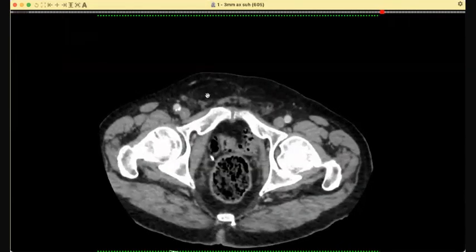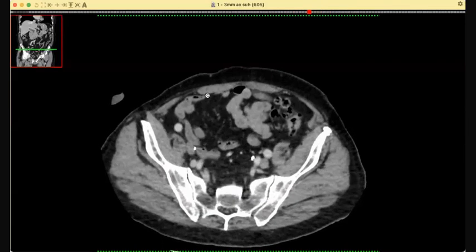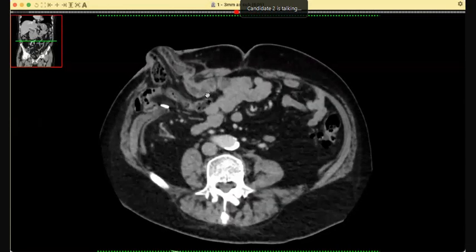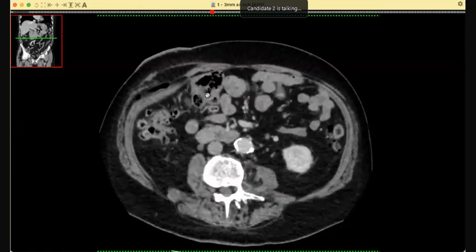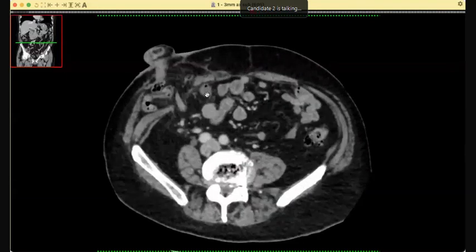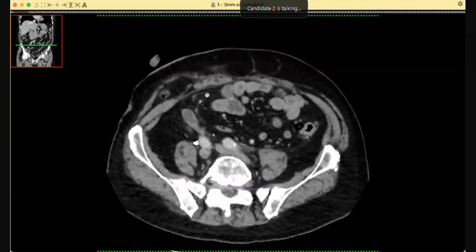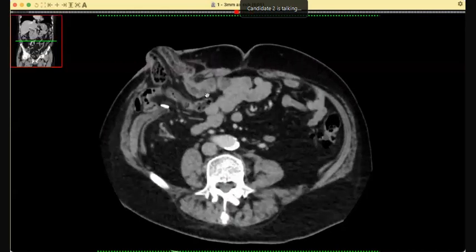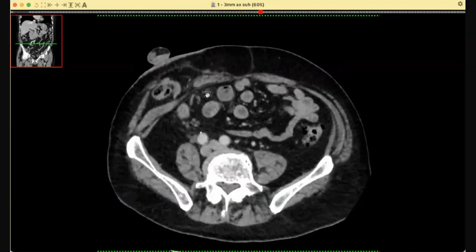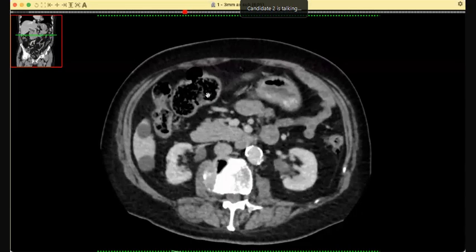Okay, so I couldn't really appreciate the urinary bladder in the pelvis, and there are lots of surgical clips denoting the urology surgery, and there is an anterior abdominal defect seen on the right abdominal quadrant, likely with bowel loops connecting into it, so likely a hernia, and there are atherosclerotic changes within the abdominal aorta, as well as the lumbar vertebrae.